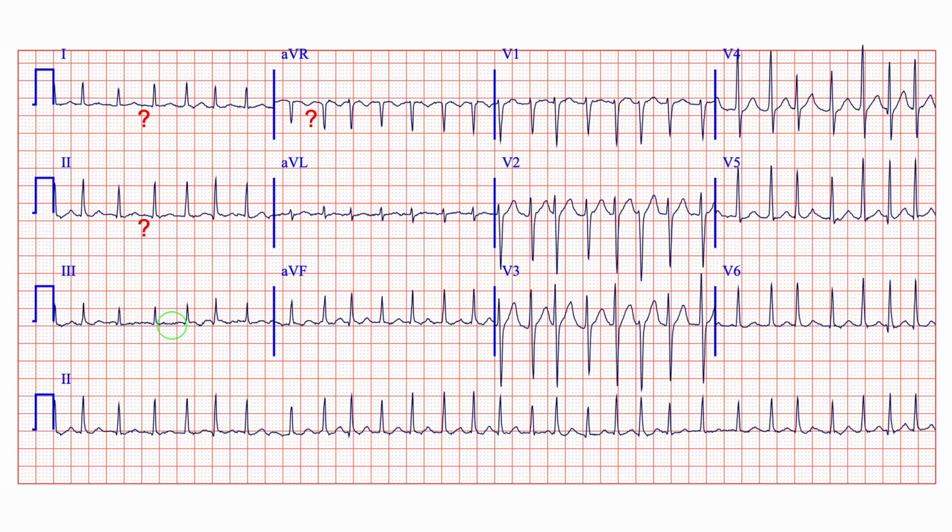Then if we look very closely here, we can convince ourselves maybe of the presence of some fibrillatory waves, which line up with the physiology of AFib as discussed, though this could alternatively be artifact or tremor, and in this case is more so just to communicate the point of looking for these fibrillatory waves. These are a lot easier to see in sections where the rate is a little bit slower and there is more space between the QRS complexes.